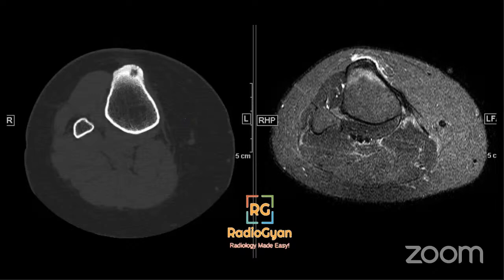Another important sign that is associated with osteoid osteoma, but usually not required for diagnosis, is something that can be seen on bone scans. So what imaging sign is associated with osteoid osteoma on bone scans? So RFA, all of you have rightly pointed out that RFA is the treatment. So the imaging sign associated with osteoid osteomas on bone scan is the double density sign. You'll see 2 densities, a central hyperdensity and a density surrounding it, which is known as the double density sign.